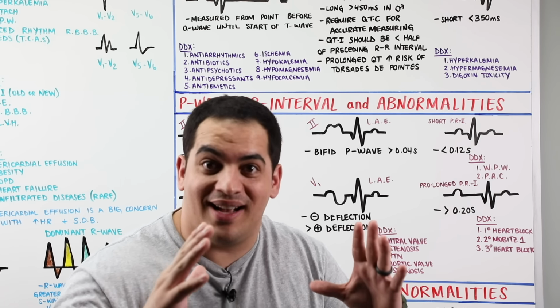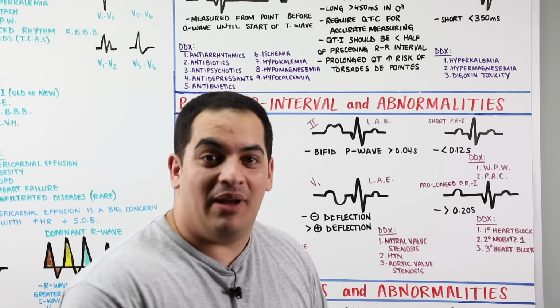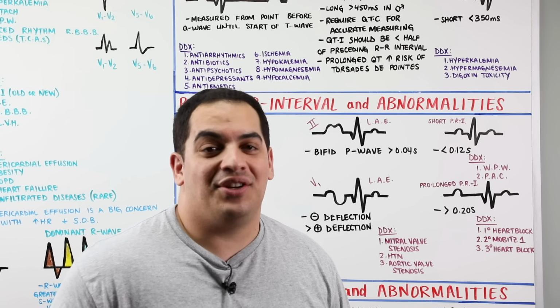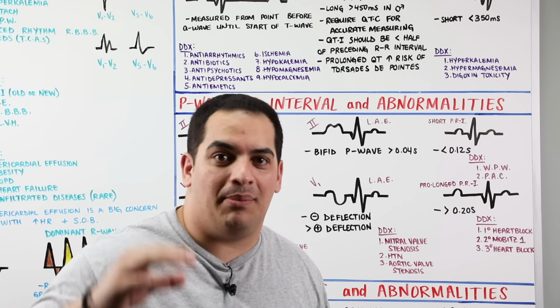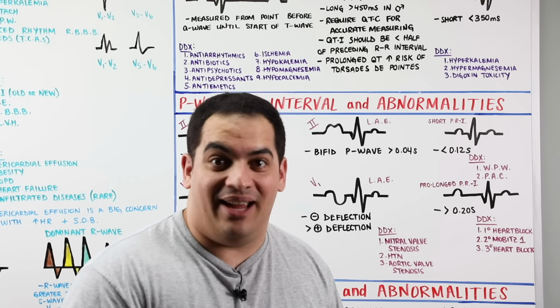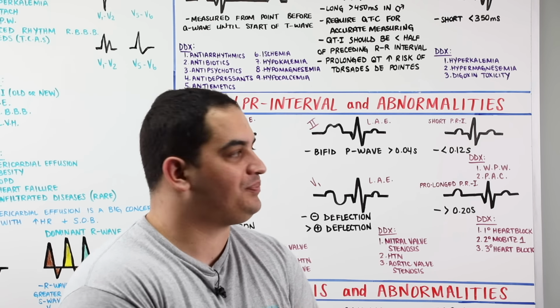It has a wide QRS. It also has that delta wave as well. So sometimes you may be able to see WPW. Another thing is premature atrial contraction. Sometimes if you have a PAC, an ectopic area somewhere in the atria that fires quicker and is closer to the AV node, that may produce a shortening of the PR interval as well.